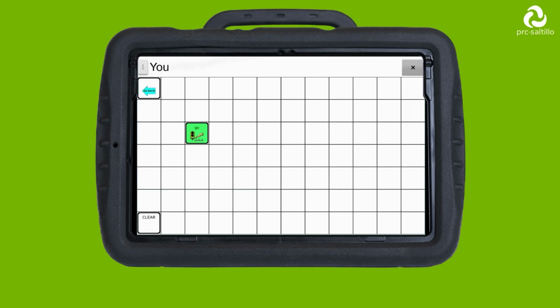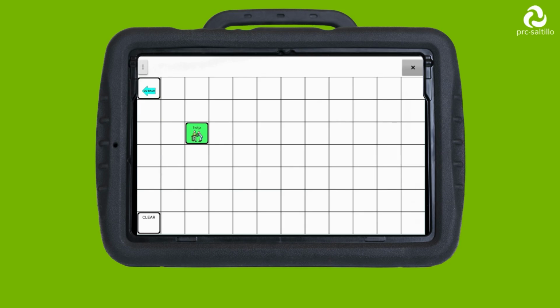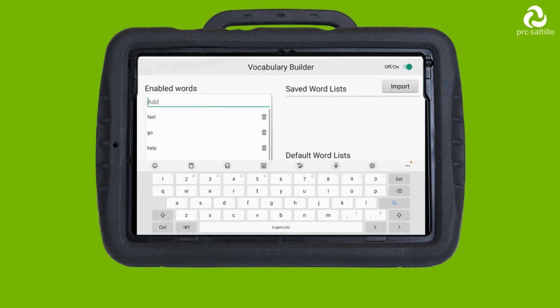You. Go. Help. Me. To go back to the full vocabulary, just return to Vocabulary Builder and turn it off.